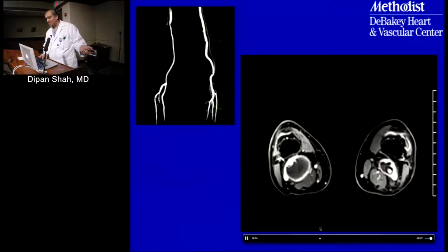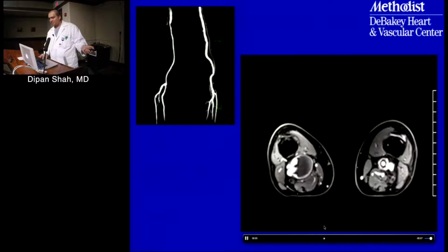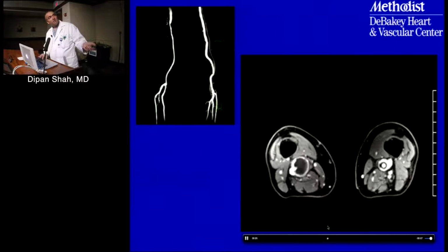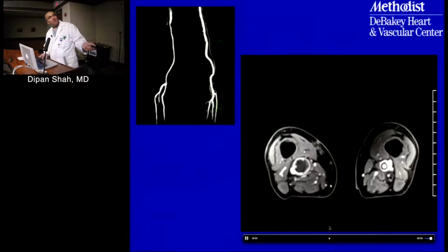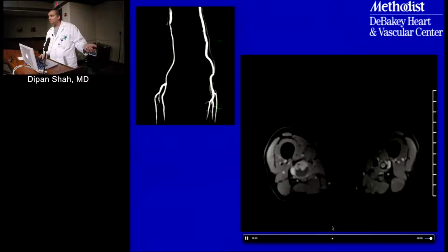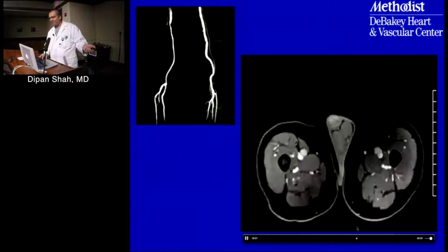Anything stand out at you here? So in fact, what is this? Yeah, he's got this big, huge aneurysm, right? So he's got this huge popliteal and SFA aneurysms.